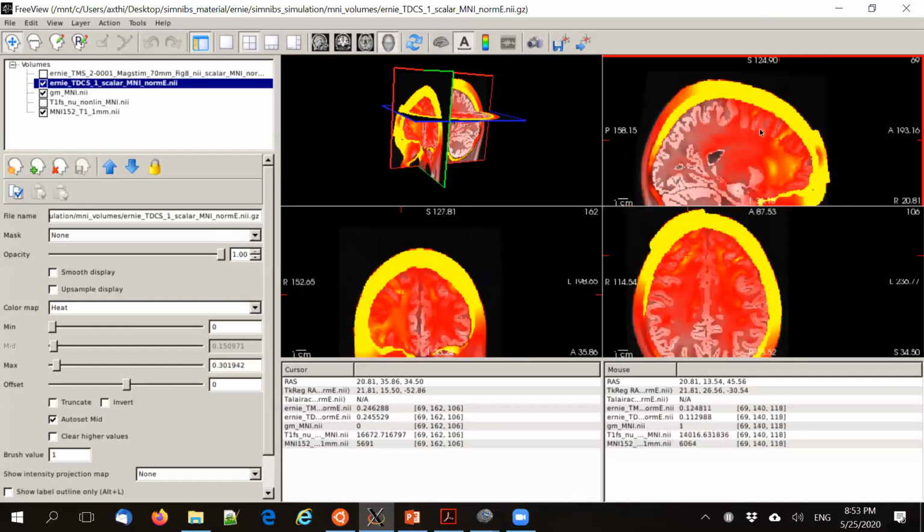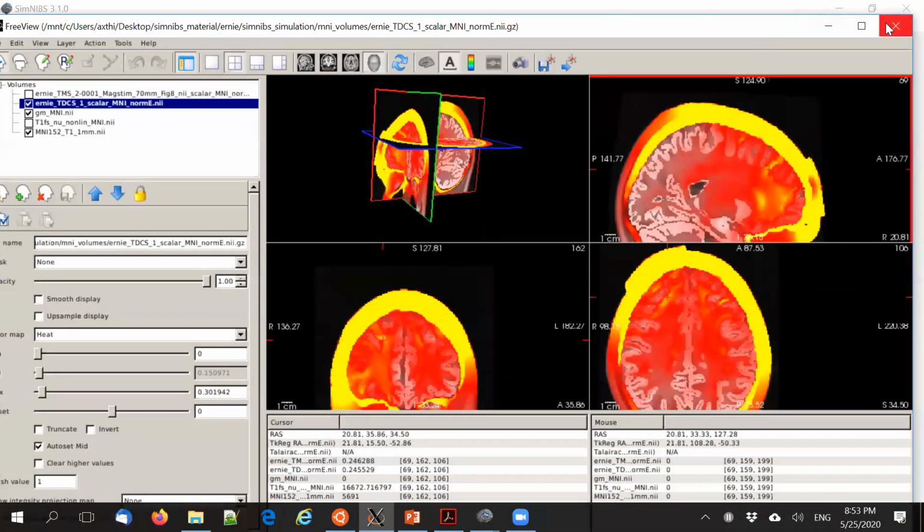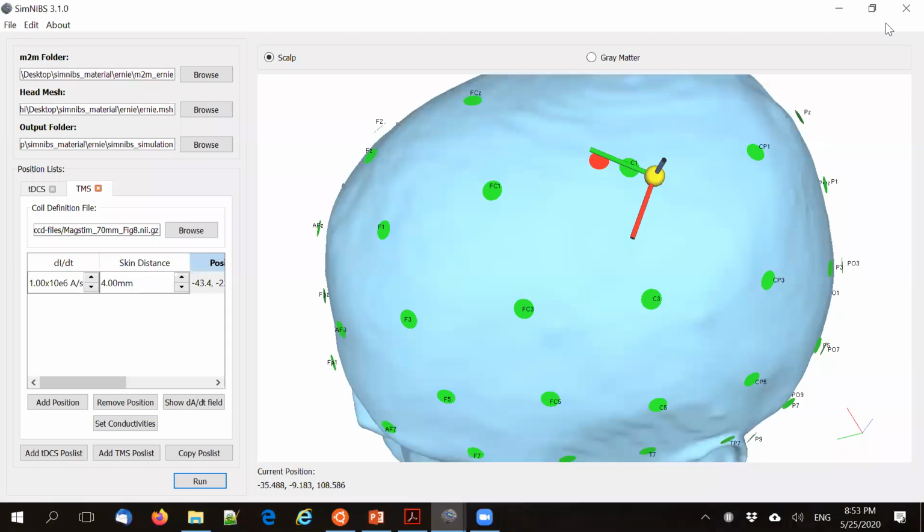For example, you could intersect this gray matter mask further with a region of interest in MNI space, so that you have an average field in this region of interest for this specific subject, which only corresponds to the field which is then in gray matter. And with that, I'd like to end this part of the introduction, and hand further on to Ula for the next part.